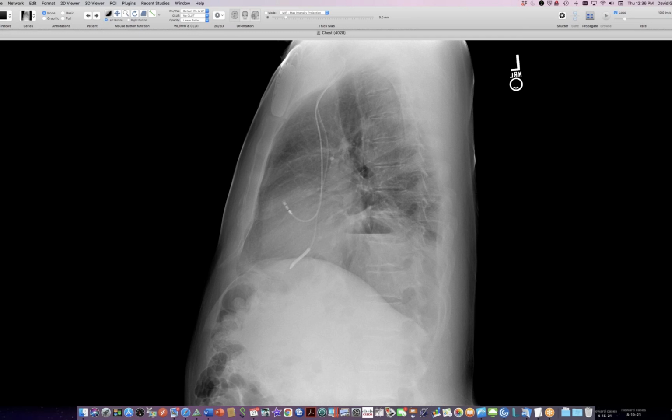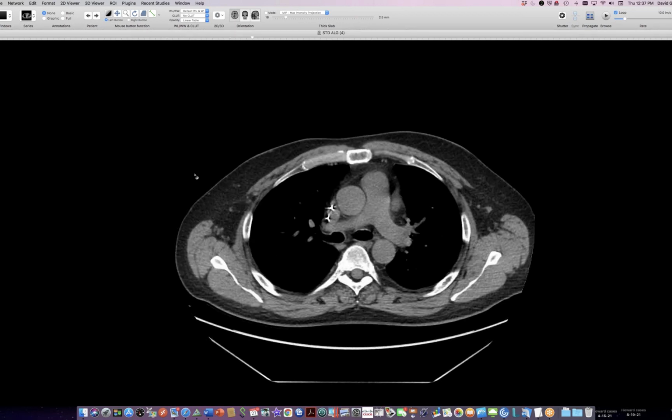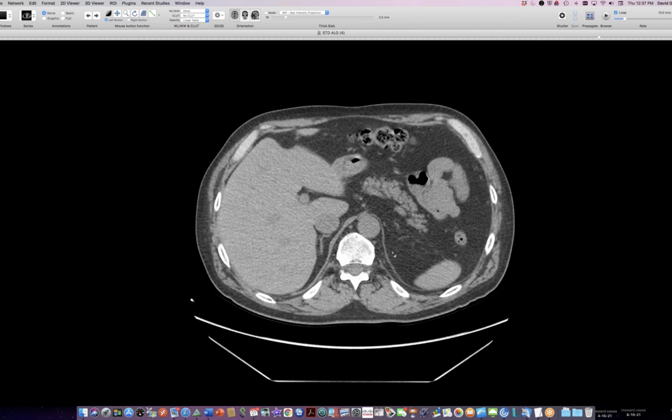So I looked again, because this man came back into our system in the last few weeks. I looked again, and now I found 20 case reports of COVID-related hemidiaphragm dysfunction. So, one of the neurologic manifestations of COVID is phrenic nerve involvement, and therefore potentially phrenic nerve paralysis or weakness. Here's what CT looks like in the course of this, and we'll see that there's pretty dramatic thinning of the posterior diaphragm muscle on the left.